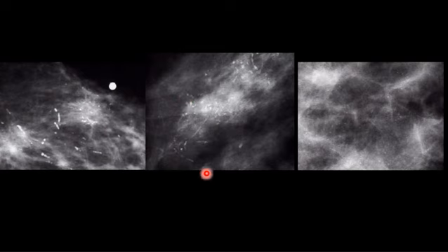This is a different patient, also a spot compression magnification view. It demonstrates thin linear calcification, which is definitely suspicious. It's calcification of different shapes in a focal area of distribution, newly appearing, not present before. So this indicates a suspicious kind of calcification. Okay, you need to worry about this, and this was a high nuclear grade ductal carcinoma in situ with central necrosis, and there was a 1 millimeter focus of grade 2 invasive carcinoma. Even DCIS plus some invasion, which is bad. If you have invasive carcinoma, it's bad. Okay?